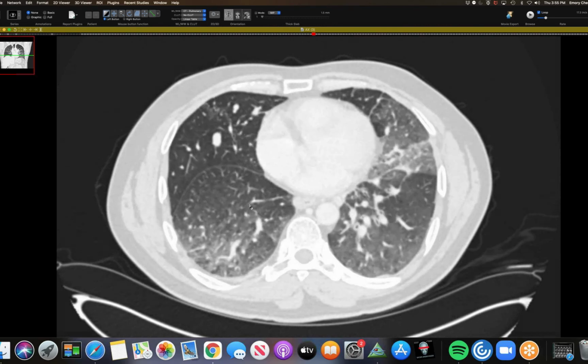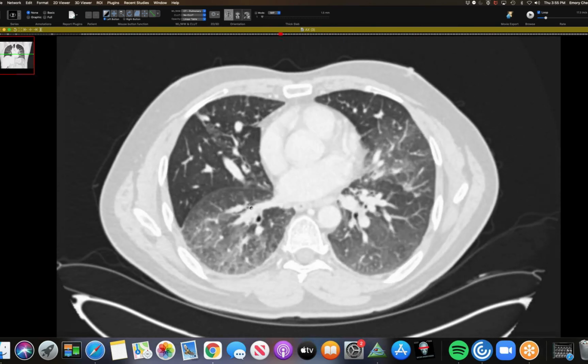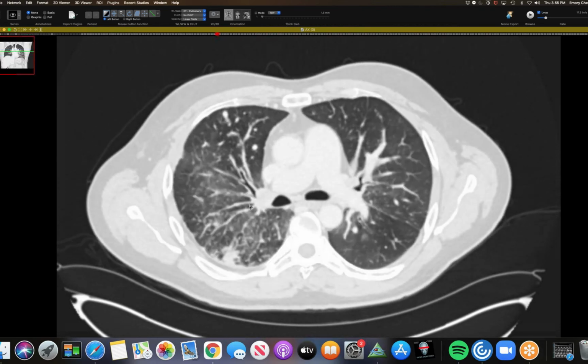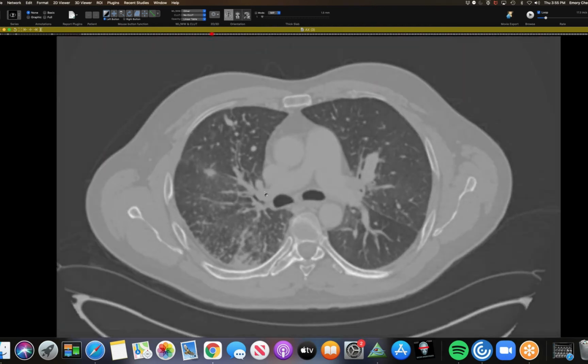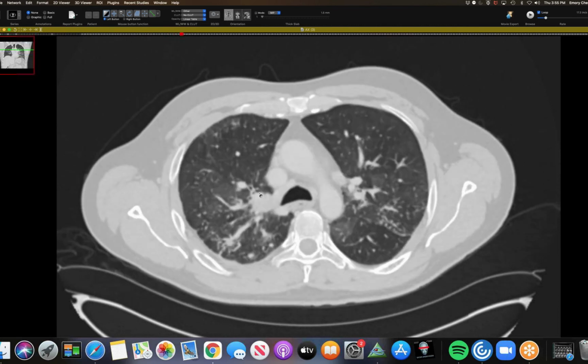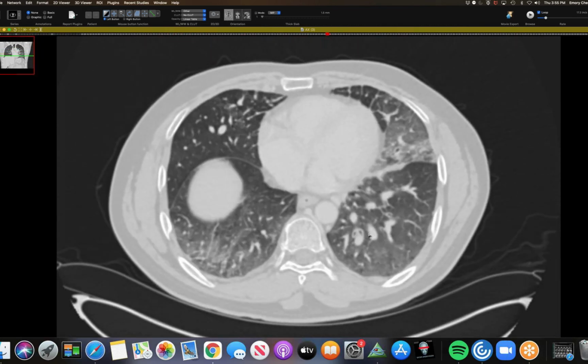And I have not seen fibrosing mediastinitis from silica or coal dust. Yeah, that's his main problem. And unfortunately, it's really severe, and he's taken out a lot of structures, and he's in a world of hurt, relatively speaking. Yeah, pretty impressive congestion here.